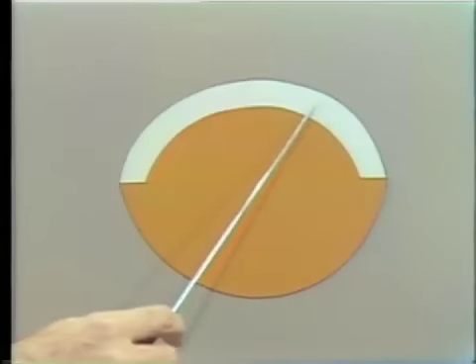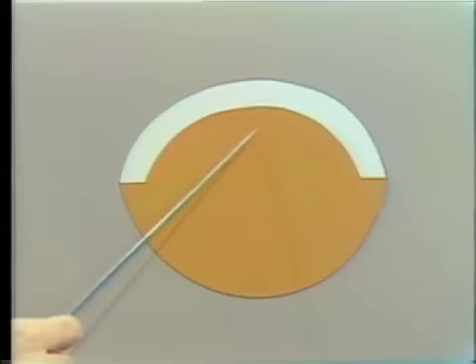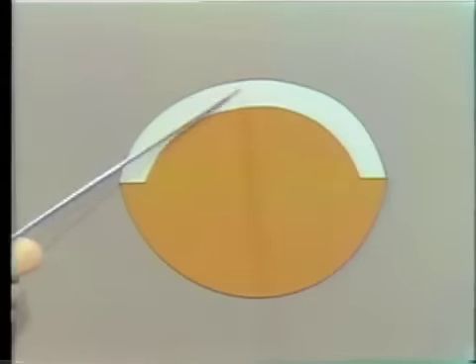And at the time the facing is cemented on, by burnishing this down tightly here, a very nice adaptation between gold and porcelain is obtained, which gives a satisfactory surface for contact with the mucosa in the ridge-lap relationship just here.